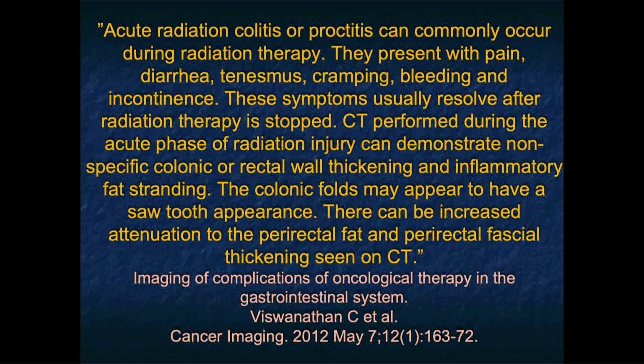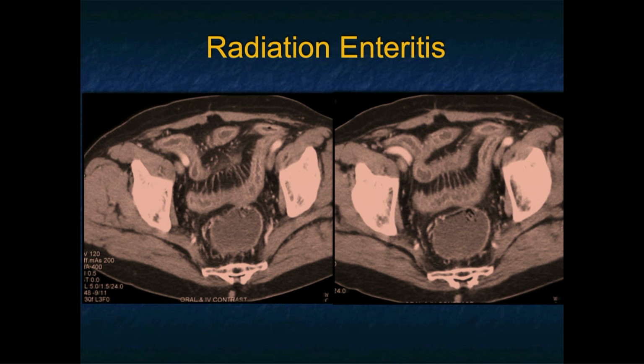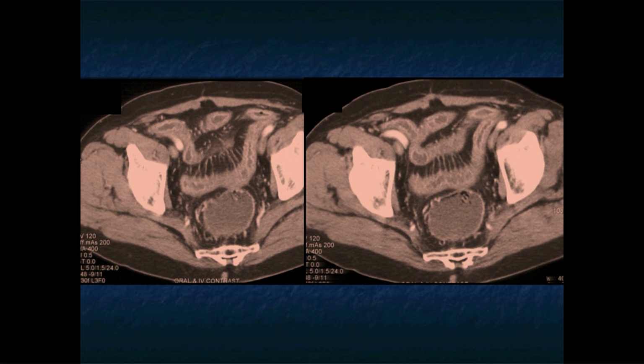Radiation colitis can be early in the disease process, or it can be late. Many patients with CT evidence of radiation enteritis are asymptomatic. Others are symptomatic. Here's just a good example. Again, the vasa recta becomes prominent. It's long segments of bowel, but it matches the patient's therapy port. So again, the history becomes very, very important.